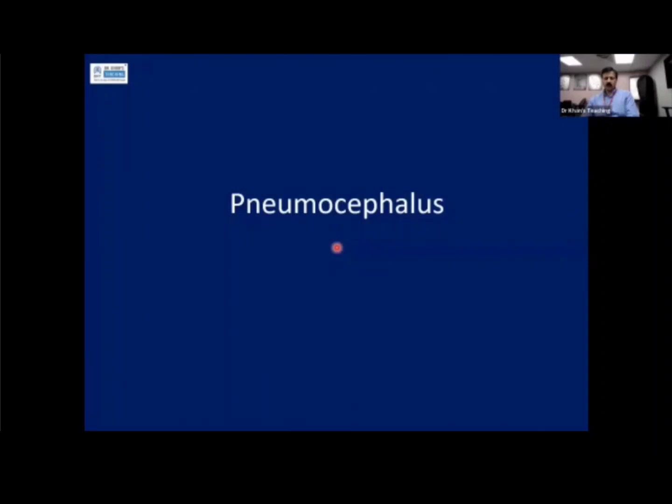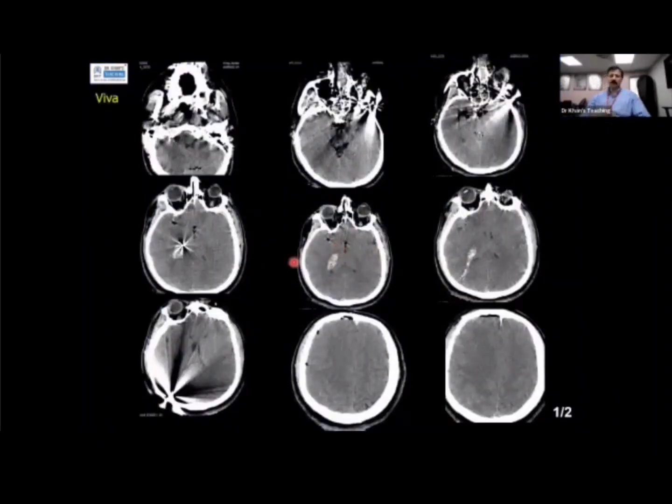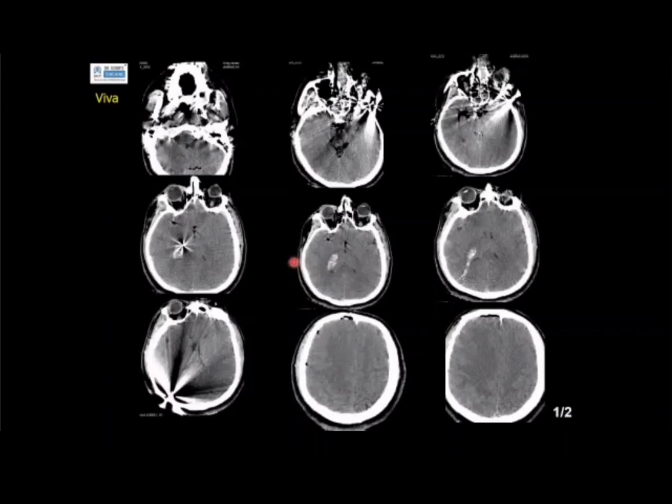So this is, okay, over to you. What is happening? Candidate 5. This is an axial CT non-contrast of the brain, which is showing an area of hyperdensity in the right parietal region, extending to the area of the... I think there's a metallic foreign body. Excellent, well done. A metallic density foreign body from the right occipital region laterally.